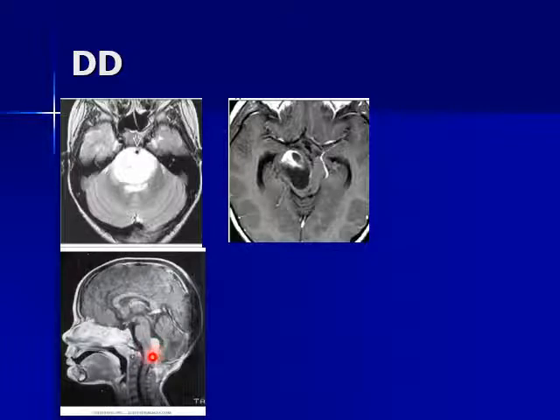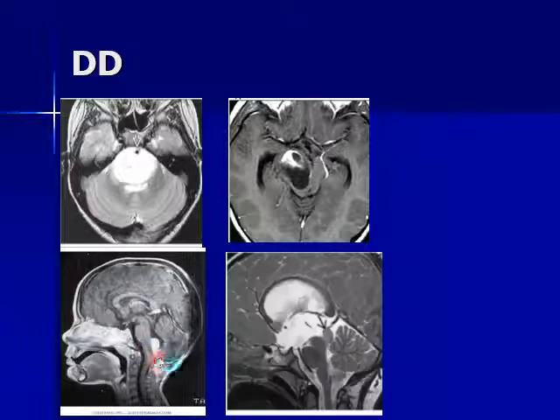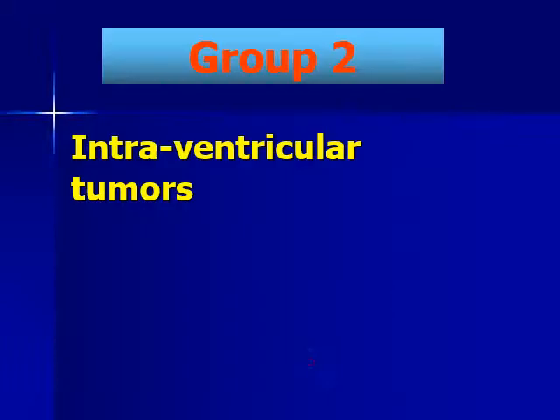So this is dorsal medullary exophytic glioma. This is very important, and you should look at the sagittal thin cuts for the tectal plate. If there is any expansion or heterogeneity of the signal in this area causing obstructive hydrocephalus, this is called tectal glioma.